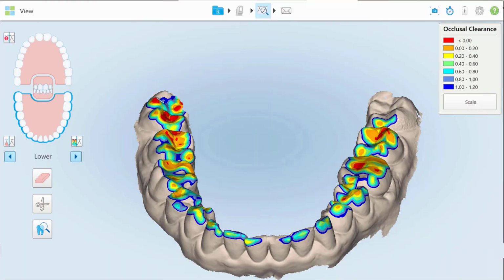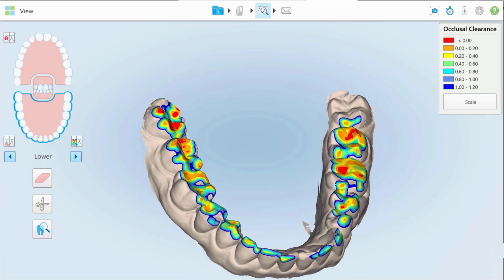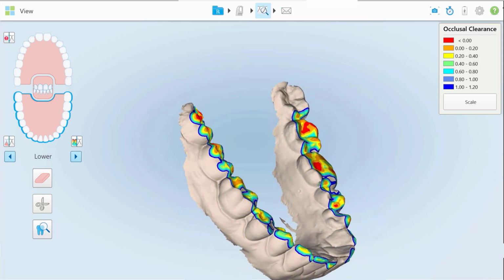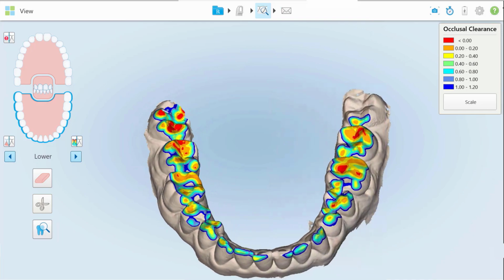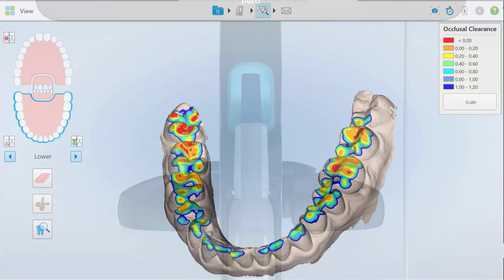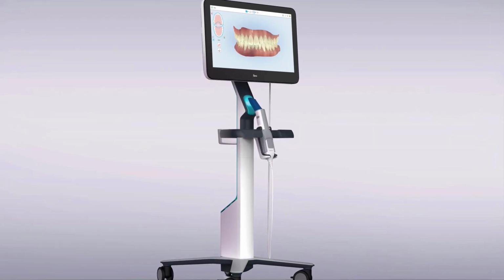The occlusogram is a simple, effective tool for assessing occlusal contacts and clearance. It also indicates the distance between two opposing arches for prepped teeth in restorative procedures. It can serve as a credible visual aid for communicating with patients about existing and predicted conditions.